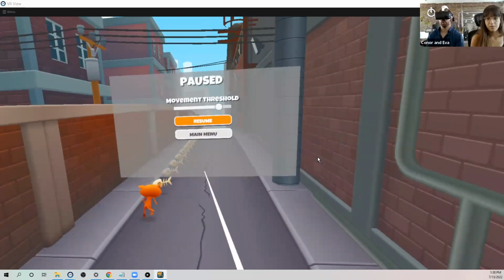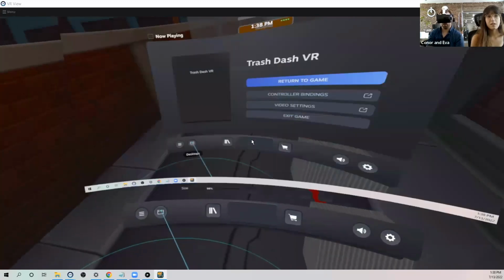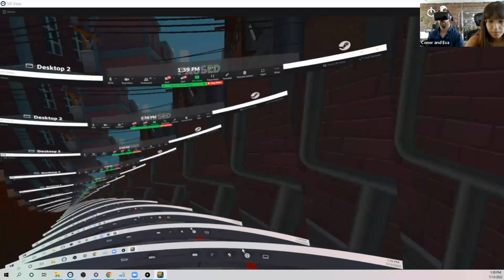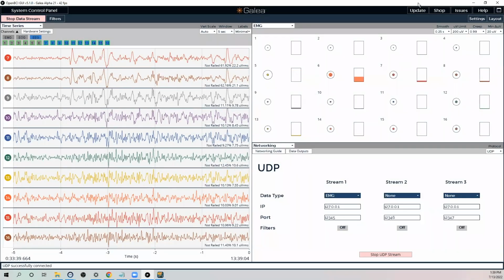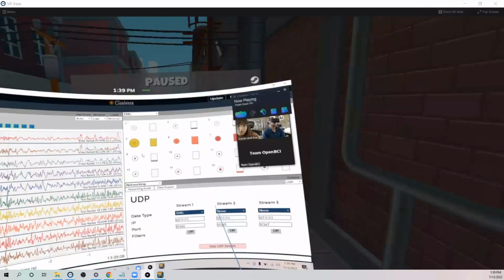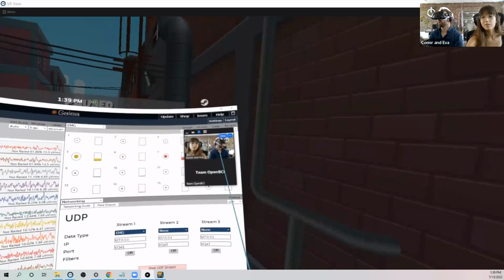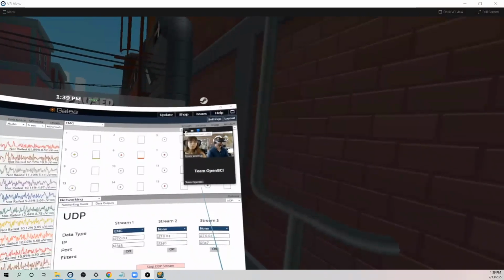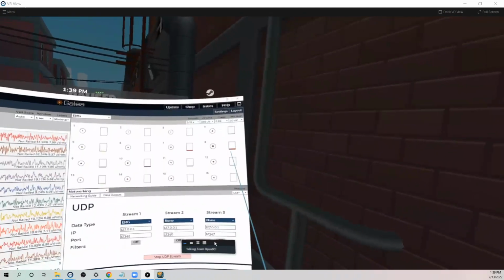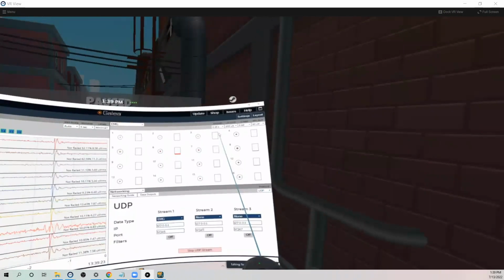Cool. I can talk through some of this, and I'll pause. Actually, can you open the GUI? Yeah, I will. Minimize this for me. You just have to change which desktop you're looking at. I'm gonna move it to the other desktop. Now it's a little small on our end, so we won't be able to see the exact things, but if you can just talk through, there are settings for these types of things. We won't be able to read each field.